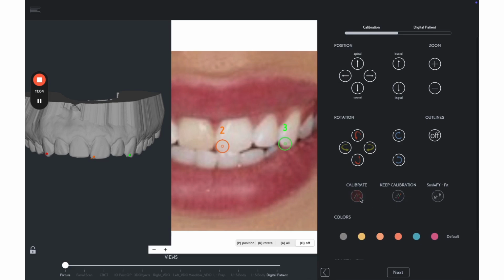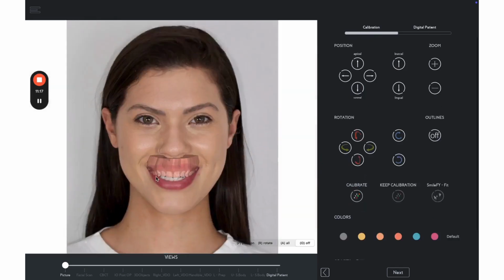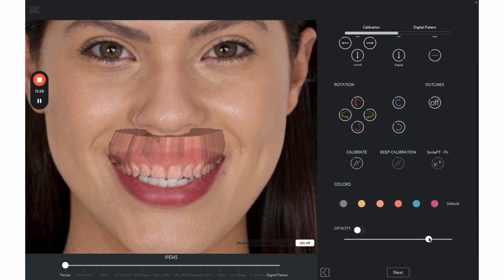If you don't see it, maybe you are on the iPad and you have it in portrait mode, you will need to scroll down until you see the Calibrate option. Select Calibrate and check the calibration. It should be 90% done here. If you scroll down, you can use the slider to take a look at the overlapping. So this is close enough.